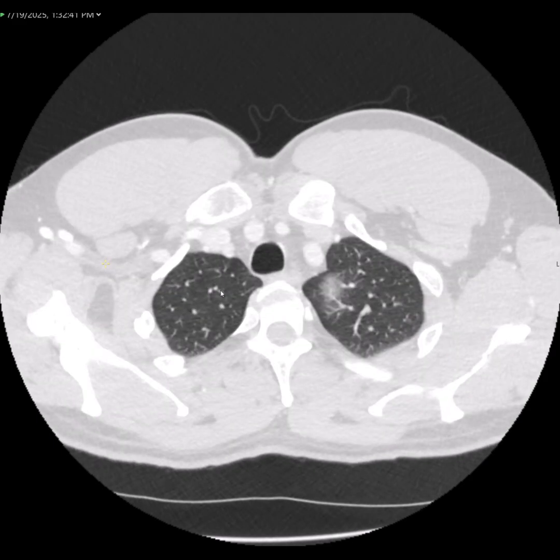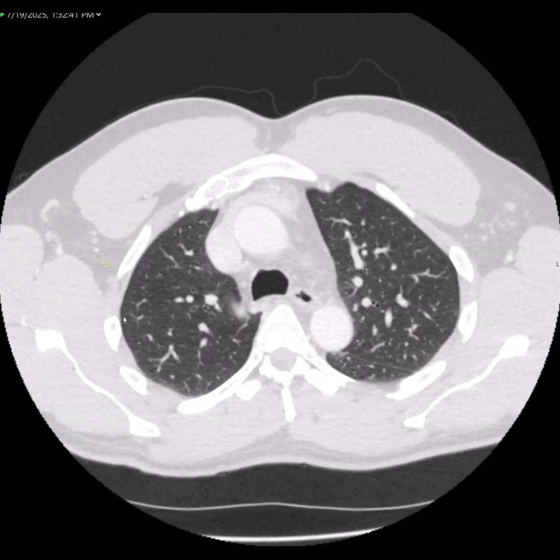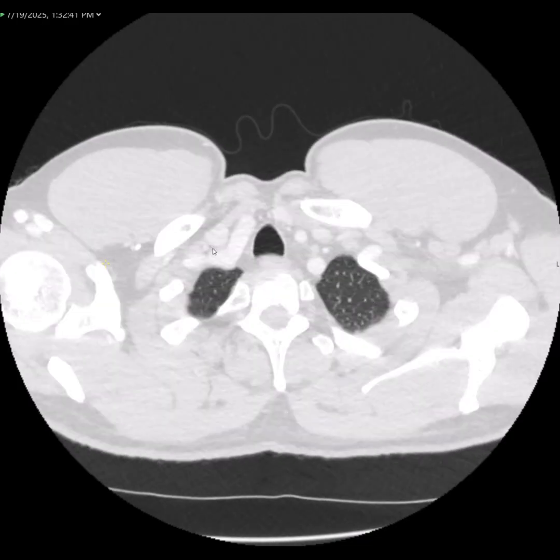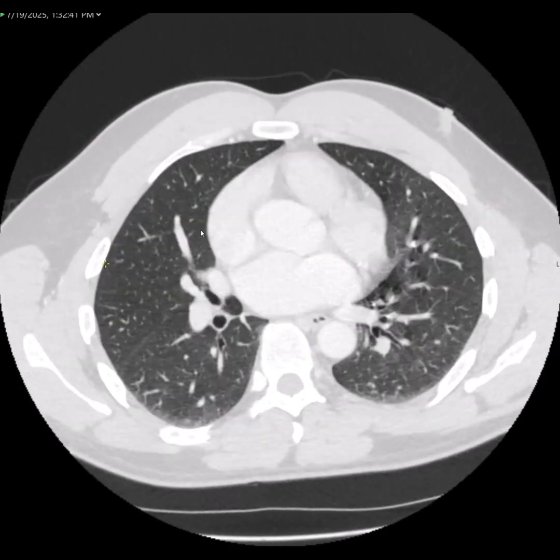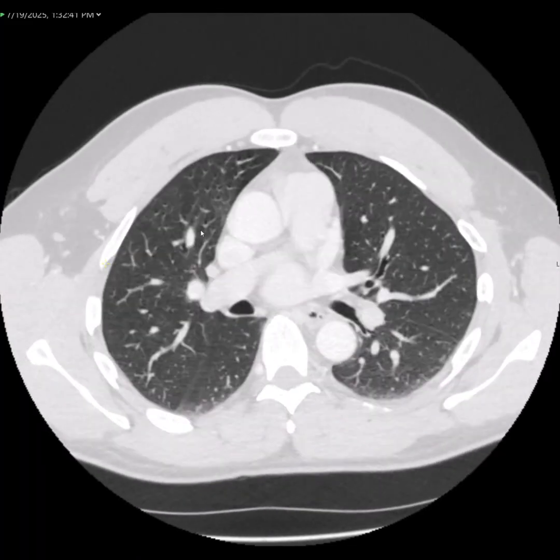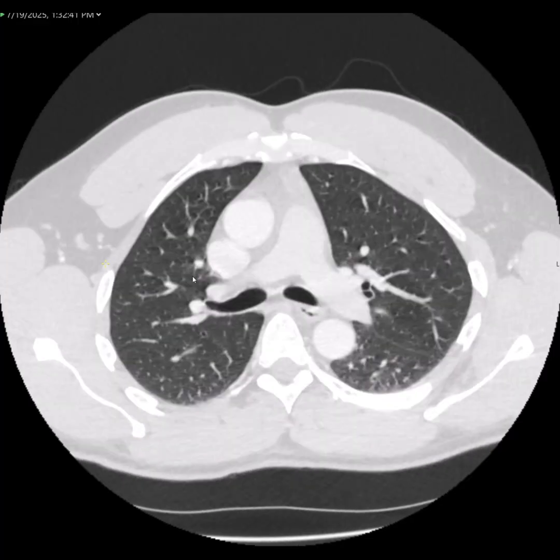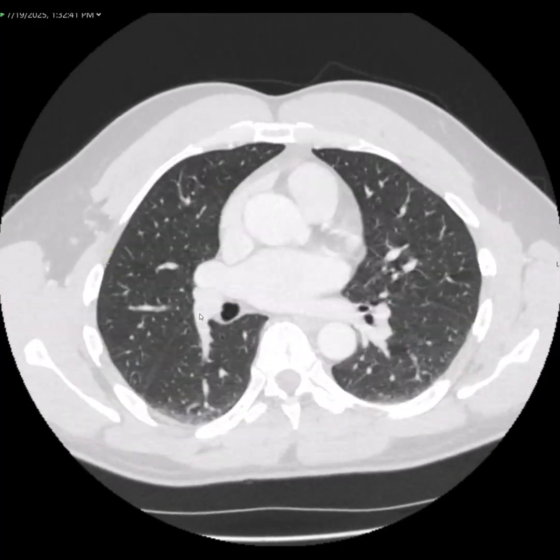After you're done examining the pleura, you want to look at the lung parenchyma itself. And here you want to break it off into 6 sections again, upper, middle, and lower region for each lung. Starting in the right upper lung, the parenchyma looks normal. Then moving on into the middle section, everything looks normal here as well. Scrolling through.